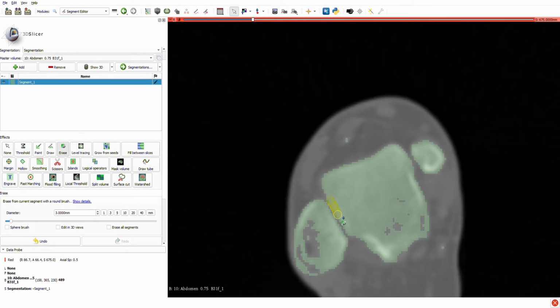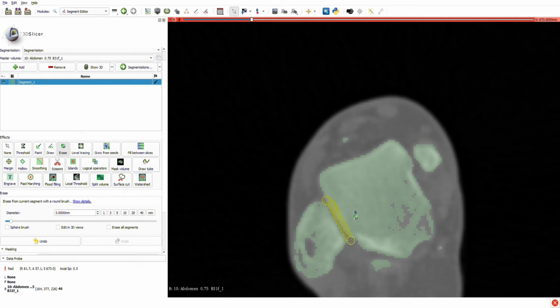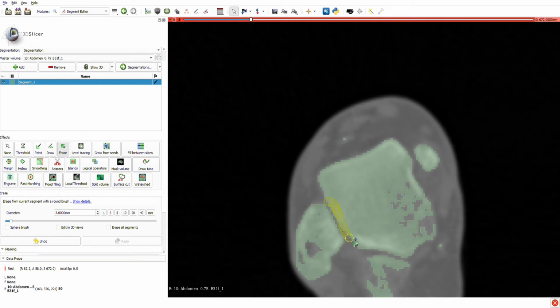As I said in the previous part, I like to perform manual segmentation because I have more control and there is less post-processing needed when the model is done with very few artifacts present.